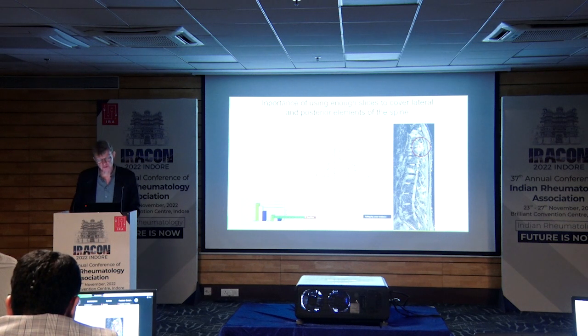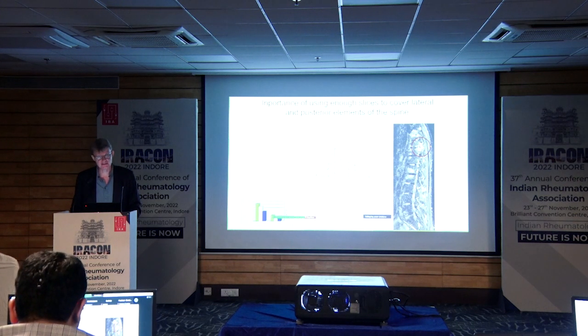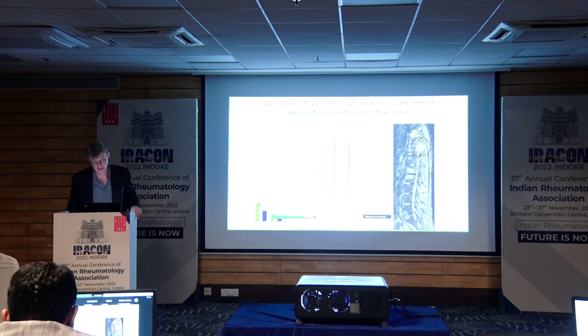And I think most radiologists do that nowadays, but 15 years ago, they just did the same thing as they do when they look for disc herniations. And then they only looked at this area, and then all the different changes you had out there would not be visualized. And that's not fair. You should do the entire spine, and also go laterally so you can see the lateral changes.